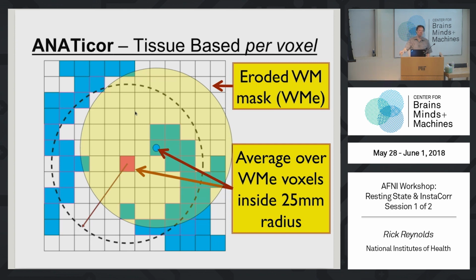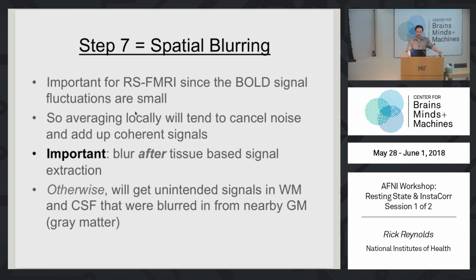Anything else is zero. So doing this with the flat disk or ball, if you will, is a lot more work than doing it with the blurred version, because you can apply the blur ahead of time and make it fairly fast, since you can do the Gaussian blur in each direction independently. So in the X direction, it's just a Gaussian blur, but only along the X-axis. Then you do it along the Y-axis, then you do it along the Z-axis, and it's faster to do it that way. Then you blur your data as much as you want to.